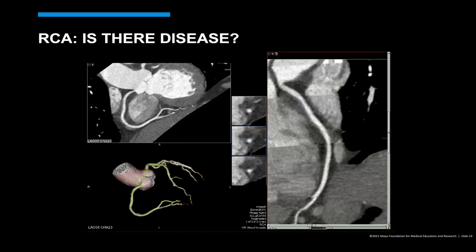Okay, I agree. And then here's another question related to this specific image. We can maybe have the next question taker take this question. Sure, that's me. Thanks, San. Okay, so Kate, the question is, you see this line right there, and there's another one right there. What do you think? And there's another one up there.